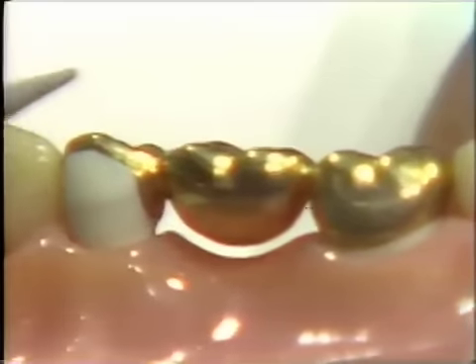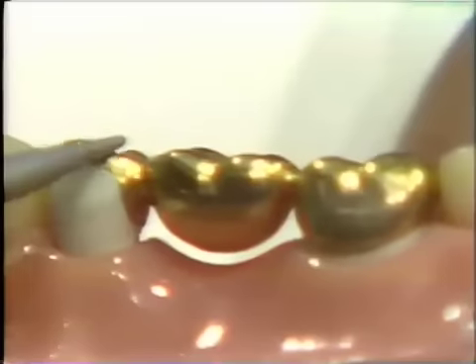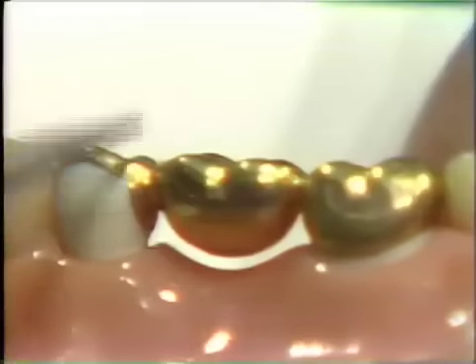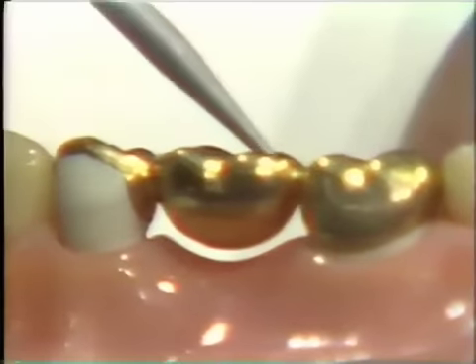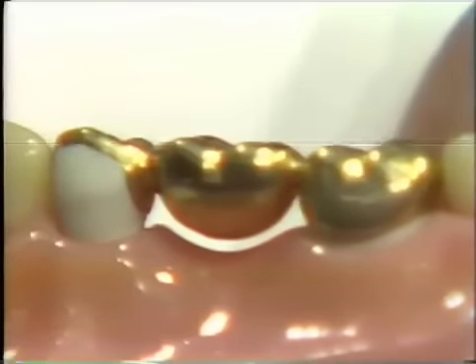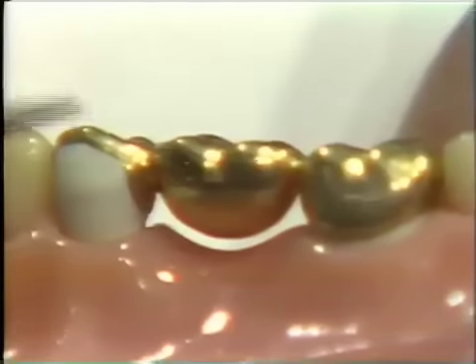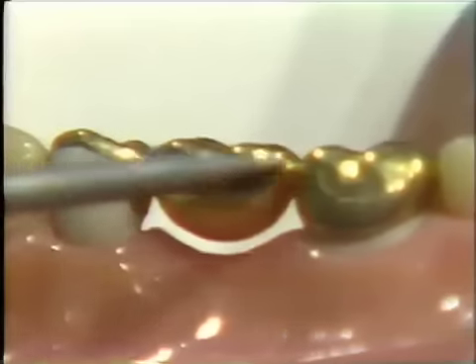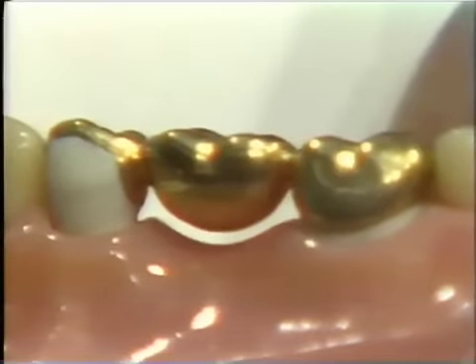And on the occlusal surface, you can see the development of the marginal ridges dropping down to the contact point and the connector on the mesial here, and the same thing on the distal, the marginal ridge dropping down to the contact point and the connector between the 2 Pontics here. The embrasures on the buccal surface here, you can see have been well rounded in there and are highly polished. But this type of Pontic serves well in the posterior region where aesthetics are not critical.